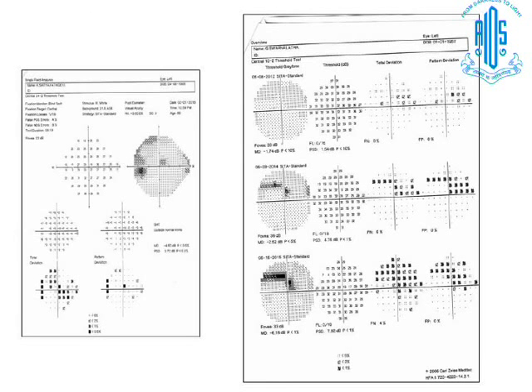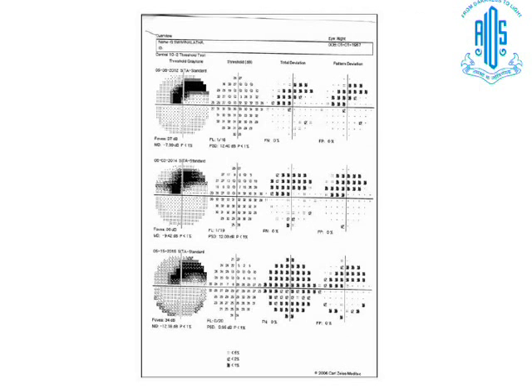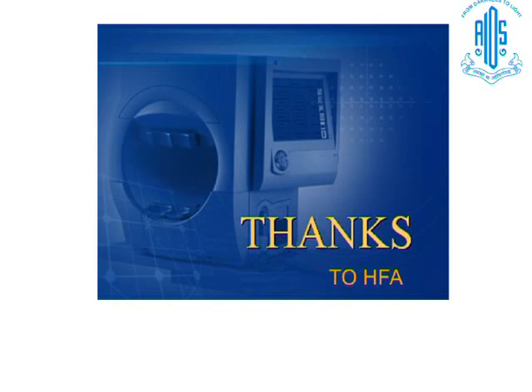You see, I told you, this patient is progressing in the 10-2, with 24-2 and 30-2 being normal. In 10-2 it is progressing, and you see the progression in the grayscale. See how beautifully you can appreciate it in grayscale. Grayscale is very, very important. I told you, Swarnalatha, the patient with a huge scotoma is progressing and following the arcuate pattern in the grayscale. See, it is progressing, but this progression is not much in the 24-2 or 30-2. Thank you.